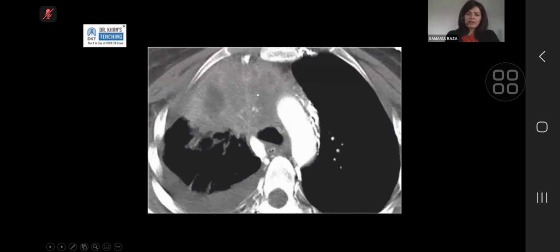When you have lesions that have necrotic-looking areas within them and enhancement around them, especially if they present with raised inflammatory markers for some other cause, they can also be reported as infection. The thing to remember, particularly for this one, is that you can't have infective consolidation entering into the mediastinum. So infiltration of the mediastinal fat is a very sinister sign, and infection doesn't do that.